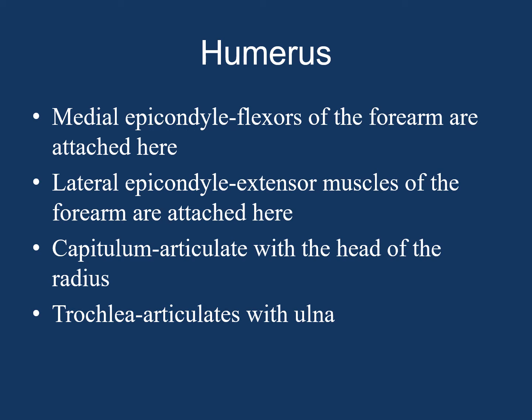You have the medial epicondyle, where the flexors of the forearm are attached. The lateral epicondyle, where the extensor muscles of the forearm are attached. The capitulum, which articulates with the head of the radius, and the trochlea, which articulates with the ulna.